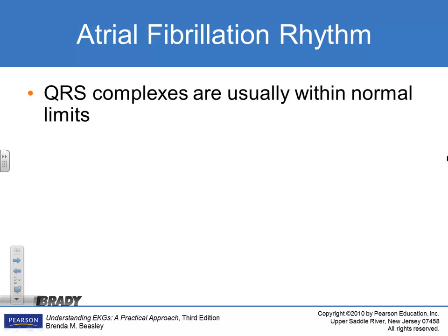What does the F stand for? Well, I don't know what it stands for. They just gave it a name. Like the T wave is just a T wave, and it doesn't really mean anything. P wave, they just call it the P wave, and it doesn't mean anything. They call these F waves, but it doesn't really stand for flutter, because we do see it in other complexes. So anything that's weird like that, if it's not a P wave, they call it an F wave. Fibrillatory waves. I have a hard time identifying an F wave on atrial flutter as, what do you call it, fibrillatory.